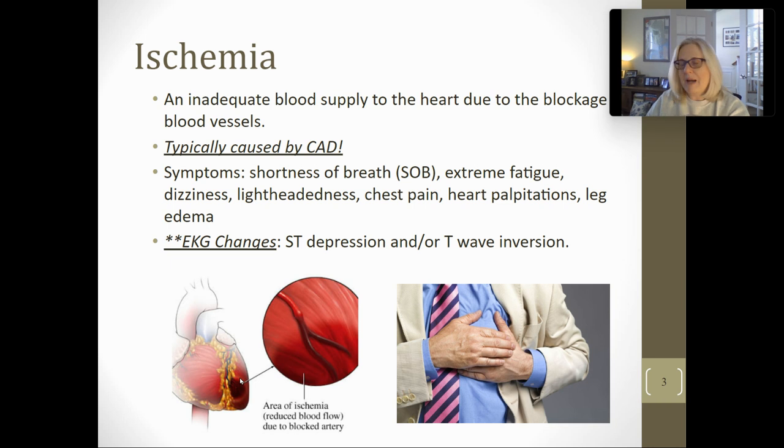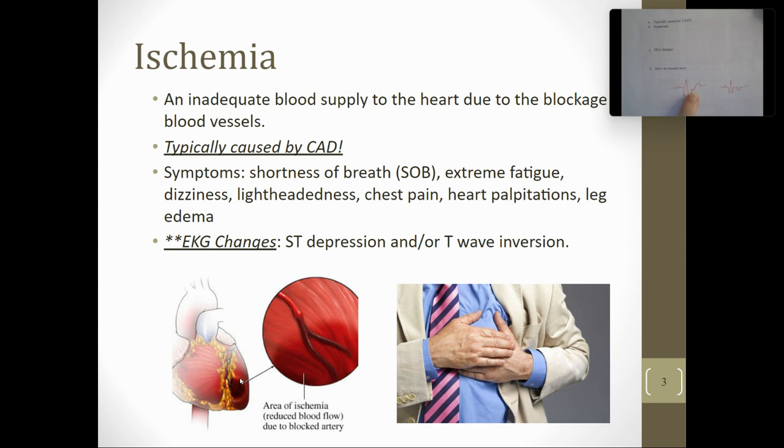I asked you on your paper to draw them. So I drew them for you. I'm going to show them in the screen here really quickly. This one right here is ST depression, and this one is T wave inversion. See, the T wave is upside down. And here, the ST segment right here is lower than the isoelectric line down here.